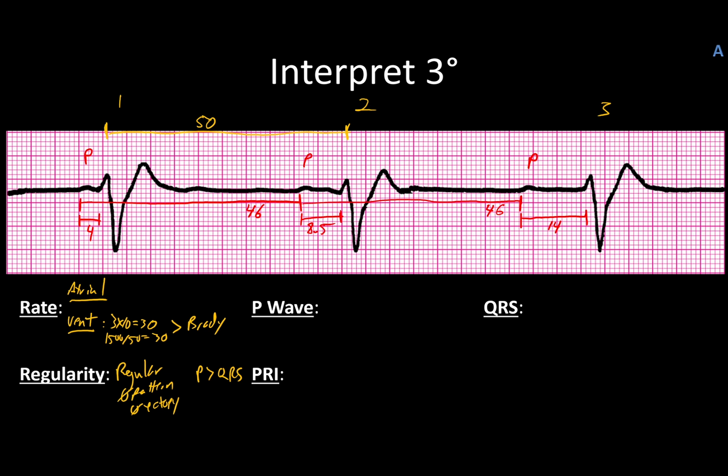Now that very well could be the case. However, if you look closely, you'll notice that there's some irregularities, and the irregularities are not consistent. If you look right here, right after that T wave, now that could easily be a U wave or something like that, but you'll notice the two of them are different. If we assume for a moment that those are P waves, and I'm actually going to change colors for this, and that they start right around here, and that this one starts pretty much around the same spot.